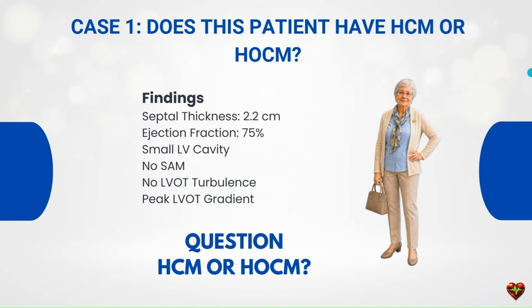Start with the anatomy. The septum is clearly thickened. The ventricle is small. The ejection fraction is hyperdynamic. So yes, this patient absolutely has hypertrophic cardiomyopathy.